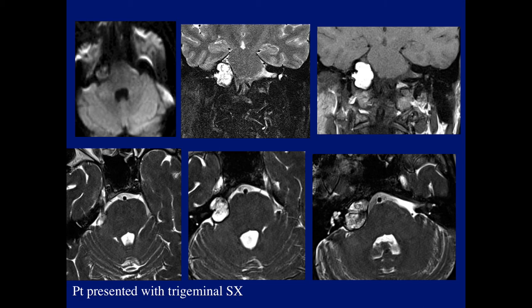Patient presents with right trigeminal symptoms. May I have some diagnoses?